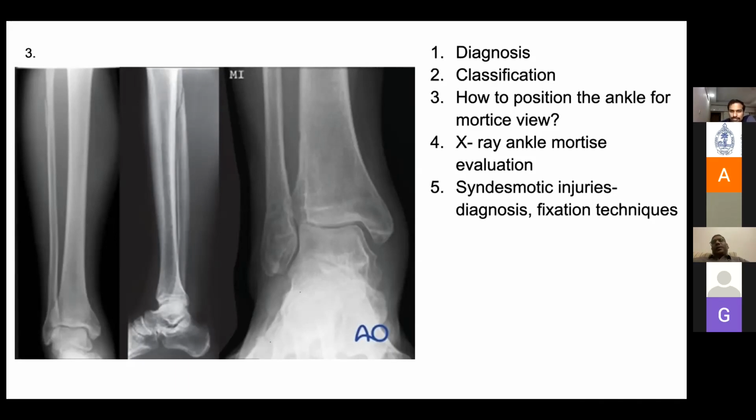Very good, very good. So there is a proximal fracture. If you look at the lateral view especially, you may not be able to see the fibular fracture in the AP view, and it may not be visible on your mobile screen, but you can see the proximal fibular fracture clearly in the lateral view. And the third picture, in the AP view, is a closer look. So what is that view called? Mortise view. Mortise view. Okay.